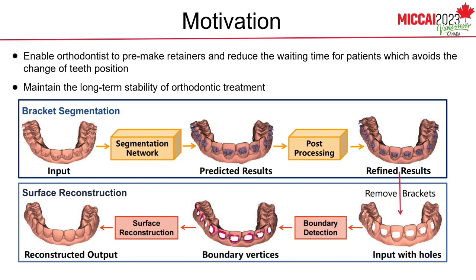Orthodontists usually use CAD software to reconstruct the tooth surface due to the clinical applicability of its reconstructed results. However, it requires interactive manual operation, and automatic segmentation algorithms cannot be deployed to the software. To automate the entire process, a 3D mesh reconstruction algorithm is also needed. Integrating segmentation and reconstruction into a unified framework can serve as an effective tool to assist orthodontic treatment.